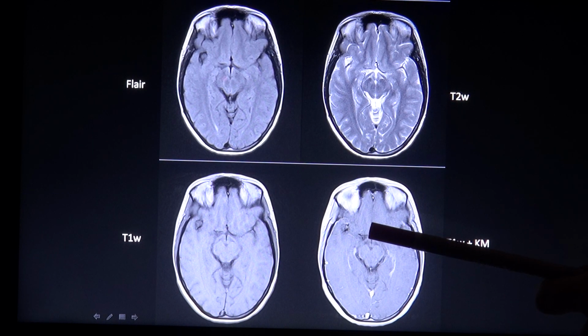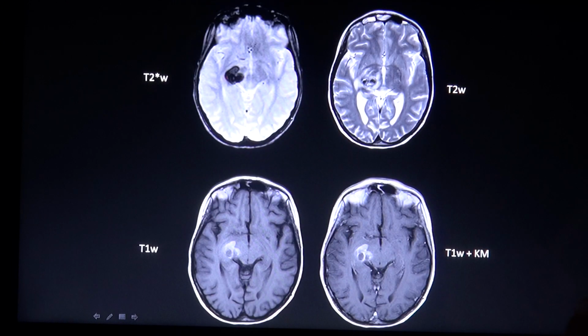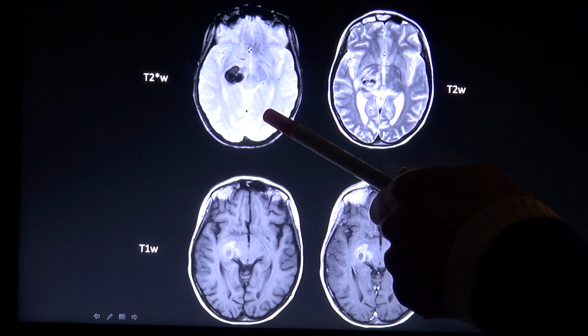Once again, speaking of the T2 star or SWI imaging, it is important to note that all structures that contain iron or calcium appear dark, which would be blood as well as bone or calcified lesions, as well as structures with iron deposition. Look for an all dark appearing image to recognize a T2 star image.